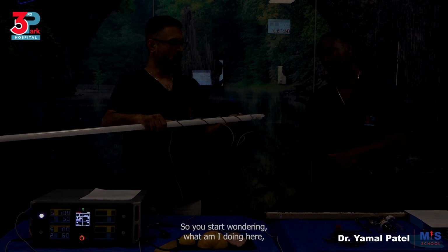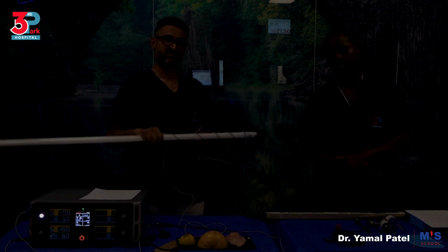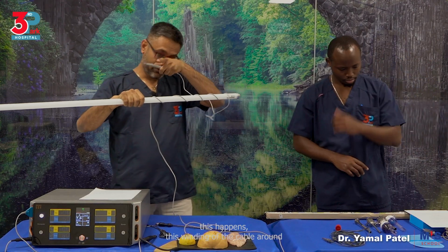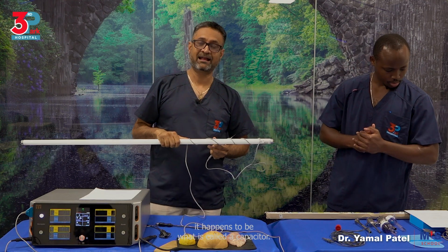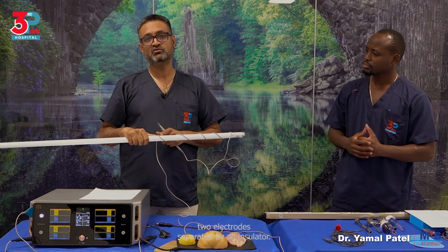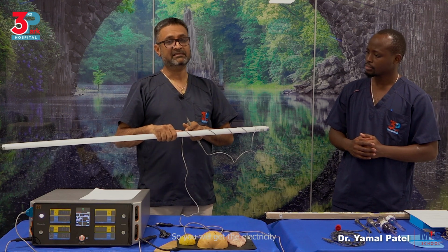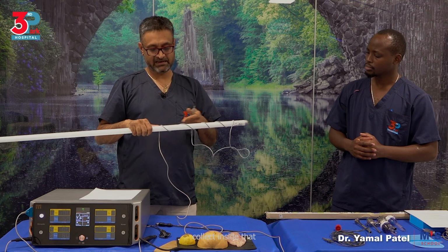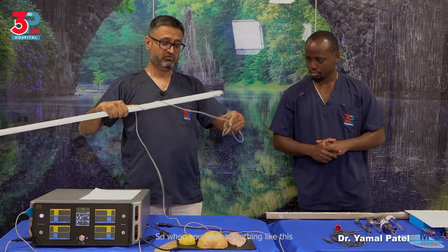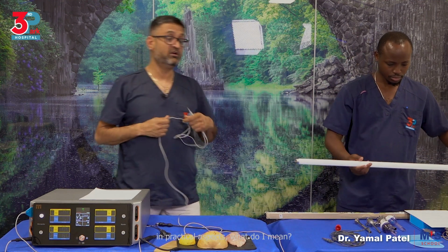So you start wondering, what am I doing here that we are activating this tube? And the reason is this winding of the cable around it happens to be what is called a capacitor. A capacitor is when you have 2 electrodes separated by an insulator. So you will get the electricity collect inside that structure.